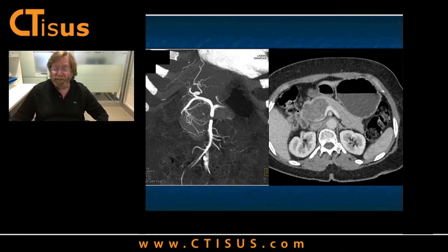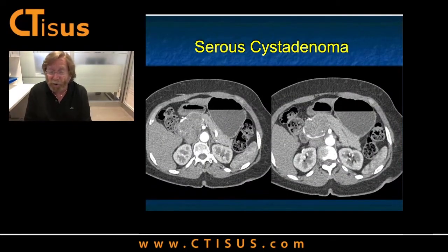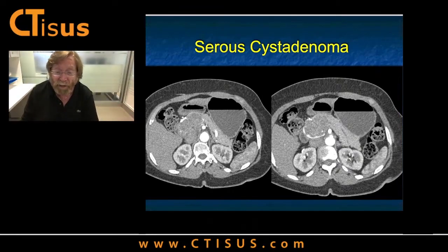What gives you cystic lesions? Usually no duct obstruction. Usually the vessels look good or they're hypertrophied and draped over. What do you got then? Well, when you got that, that's when you got serous cystadenoma. Again, a great mimicker. We talk about 3 different types. Oligocystic. We talk about calcification, usually centrally, but not always. Just a really, really great case.